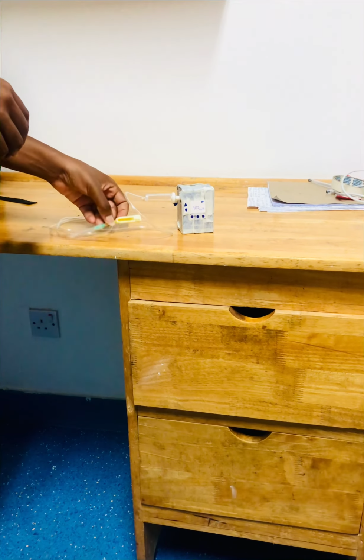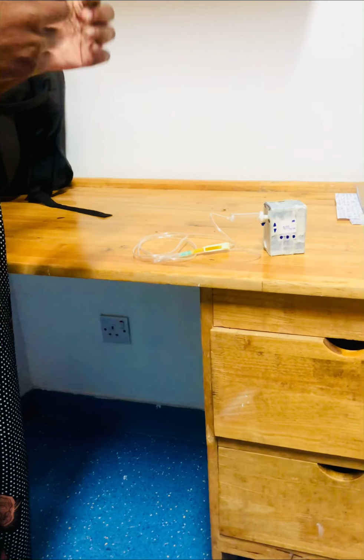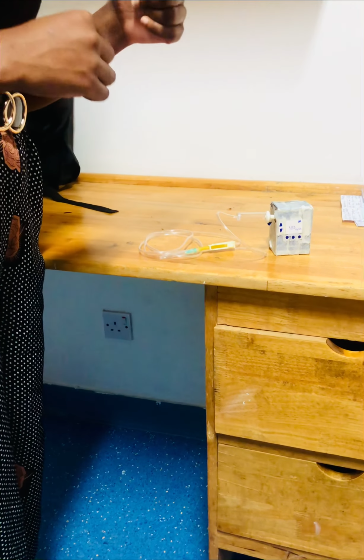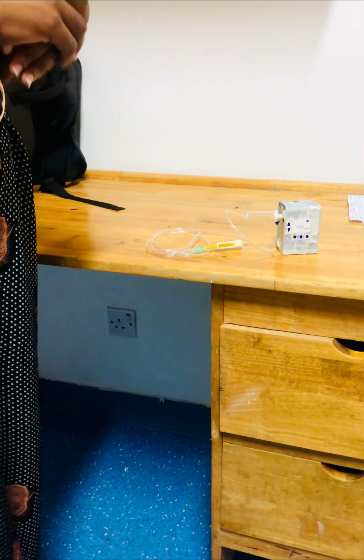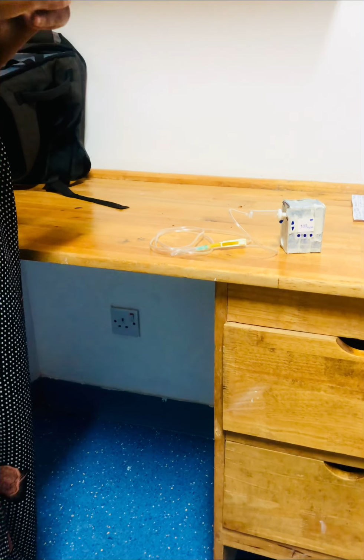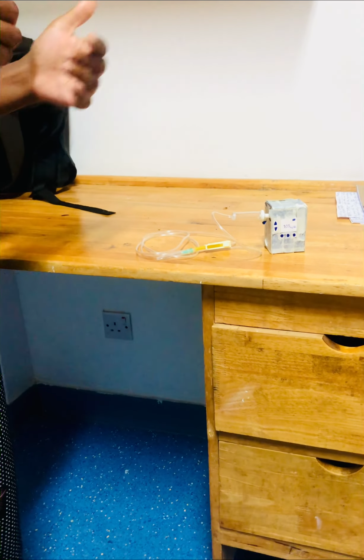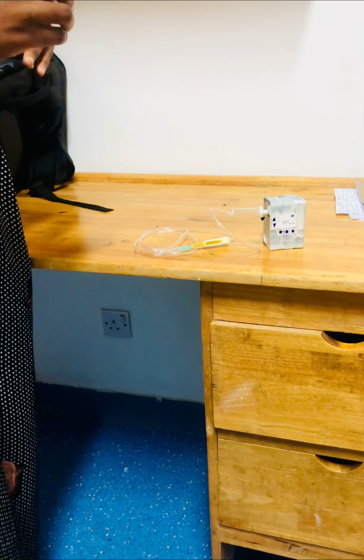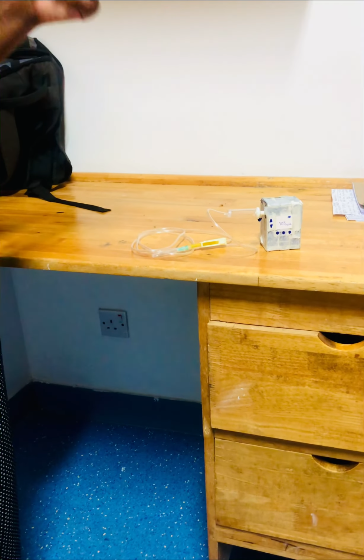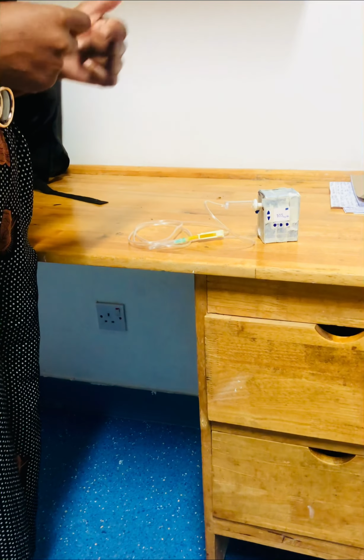After the drug has been delivered, the counter will start counting another set of 6 hours. That means the drug will be given 4 times a day, every 6 hours. And after the time that the user has set, the microcontroller will beep an alarm to inform the user to enter new values into the system.